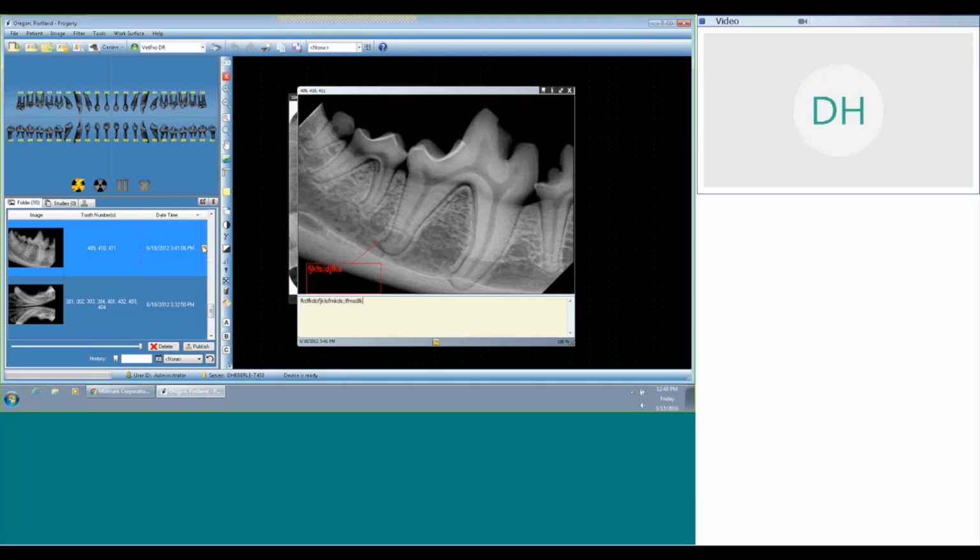And this is really great because if you're taking your images and then the doctor later is coming to take a look, you can maybe put some charting information in here. When the doctor comes back to review, he or she can put treatment notes or plans in there, information on rechecks, any kind of information you want to add in here. But do know that the information you add to this text window will get printed out on that client handout. So just keep that in mind.